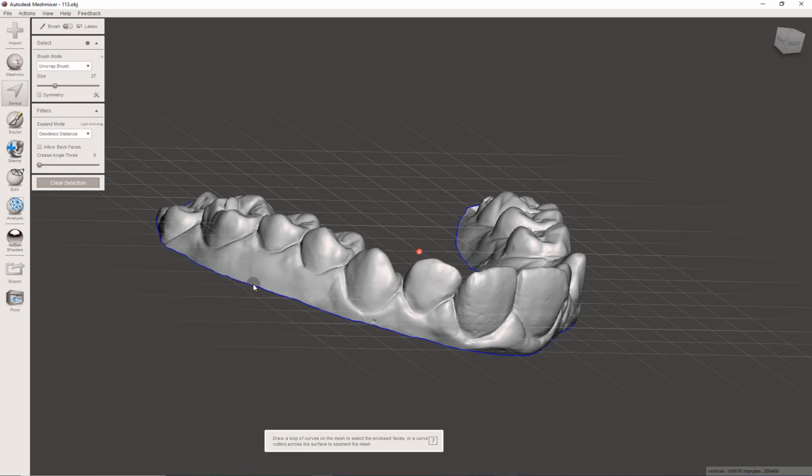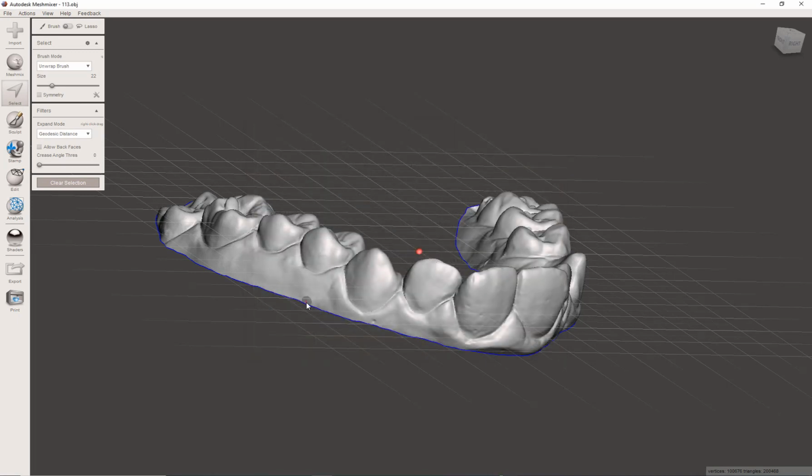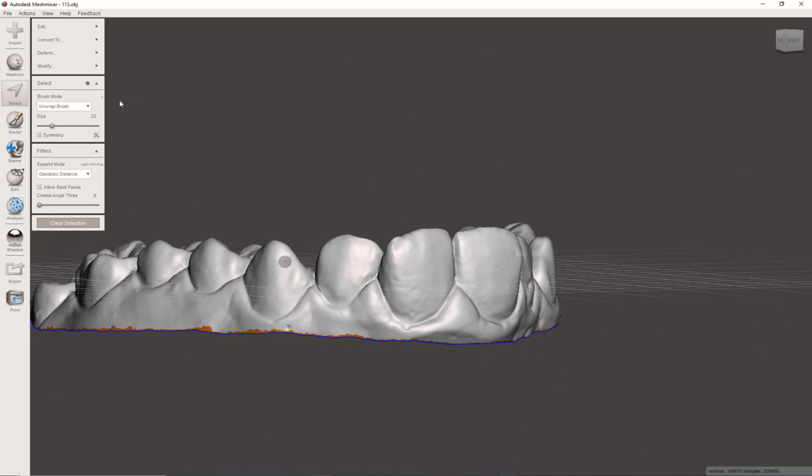First of all, I like to control the selection point. Let me show you where you can do that. Go to Meshmixer's navigation mode. With the mouse wheel, you can increase the size or reduce it. Here we double select the edge and it will select all the edge.